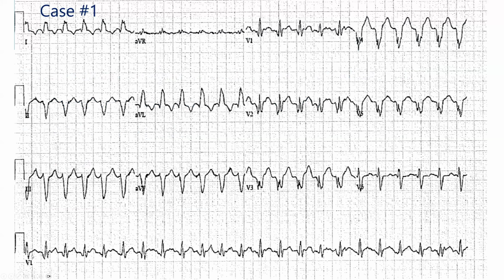As you go across, one question you can ask yourself is, do you see a P wave? Is there evidence that this is a sinus tachycardia or an atrial tachycardia? Well, as you go across, it's hard to say that there's definitive evidence of a P wave in all cases, although every now and again you'll see some notching either on the distal end of the QRS complex, or sometimes you'll see a notch just before the QRS complex.